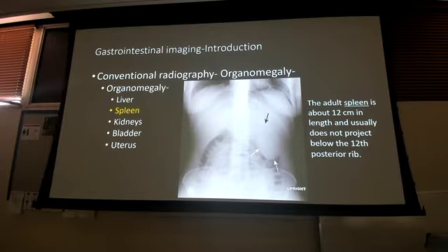with my descending colon into my transverse. It is being pushed this way. The white arrows are showing you the edge of the spleen and the edge of the bowel to show how the bowel gas is being displaced. It should be sitting up here, right? Because the spleen should be well under the ribs.